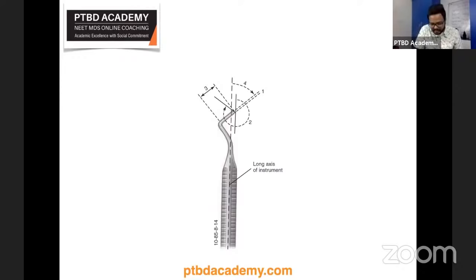The first number indicates the width of the blade of the primary cutting edge in tenths of a millimeter, as you all are aware. The second number of a 4-digit code indicates the primary cutting edge angle. If the primary cutting edge angle is absent, then we only have a 3-digit formula. The third number indicates the blade length in millimeters, not in tenths, in millimeters as such.